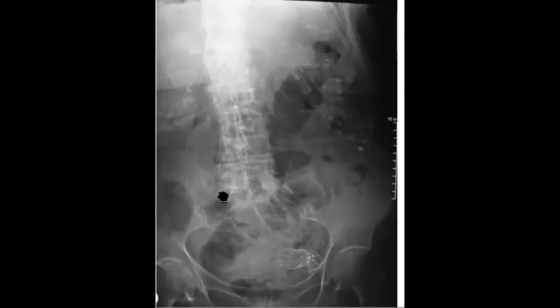Okay. So good that you at least remember the history, because the most important thing is to remember the history when the examiner tells you, and you expect this. So maybe something happened with this stent. Maybe it was in the esophagus. Maybe it migrated. But at least, if you don't have anything else, you have dilated bowel loops.